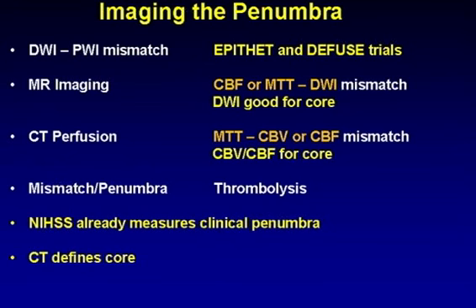So that's the holy grail for stroke imaging in the last few years: trying to image the so-called penumbra. Initially a lot of the work was done at the Mass General group. Initially there was a penumbra that was seen between the diffusion and perfusion weighted imaging mismatch. And then later on when CT came along, people tried to find a penumbra with different CT perfusion maps.